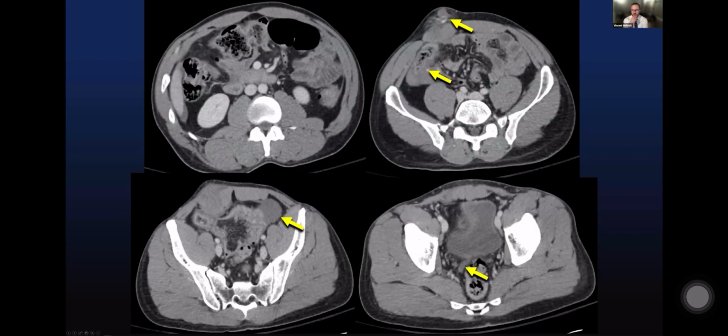This patient was not in a motor vehicle collision, but rather was stabbed in the right lower quadrant. You can see the stab wound started here in the subcutaneous tissues with some active bleeding, and there's subjacent thickening within the cecum and the terminal ileum. There's hemoperitoneum in the lower abdomen and a focus of intraperitoneal active bleeding. Clearly a patient who needs to be explored, and this was a knife wound causing a small bowel injury.